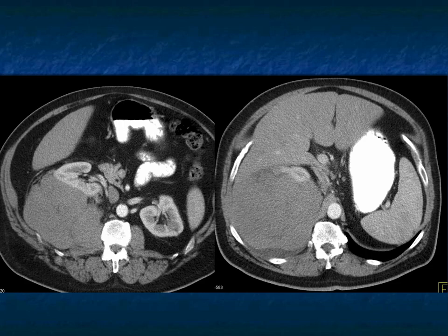It's a great question. Well, think about it. What occurs in that area? Well, one thing is you can get metastasis, though that would be really large, and the most common thing to go to that region would be melanoma. You could have high density if the patient had a renal biopsy or had trauma, but you might expect to see active bleeding, and this really is solid. It doesn't have the look of blood, and there's nothing anywhere else.